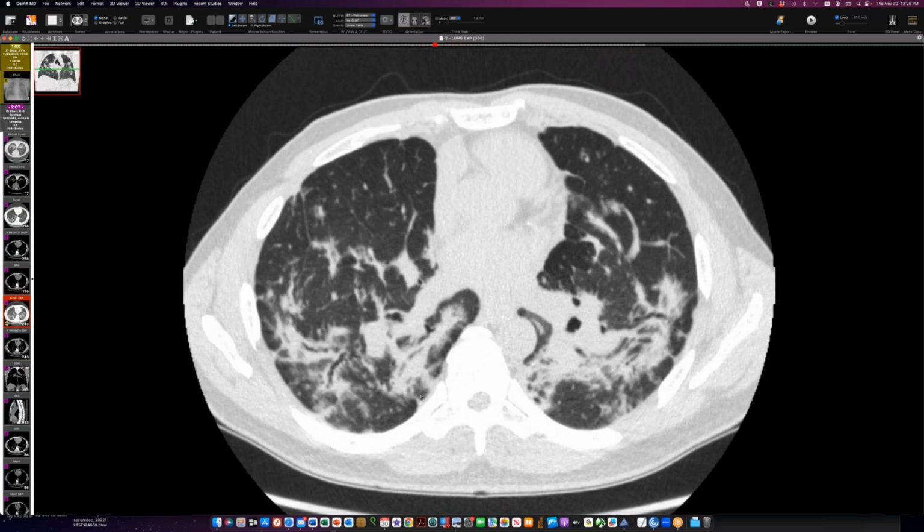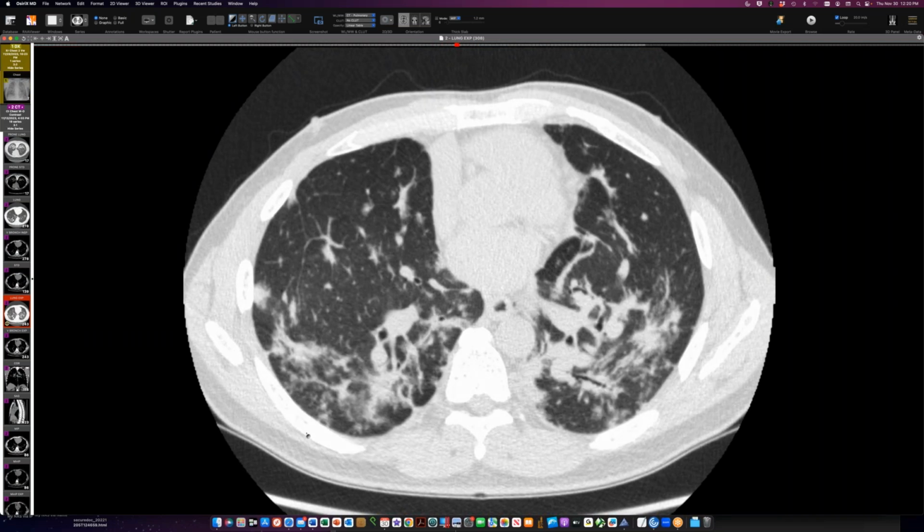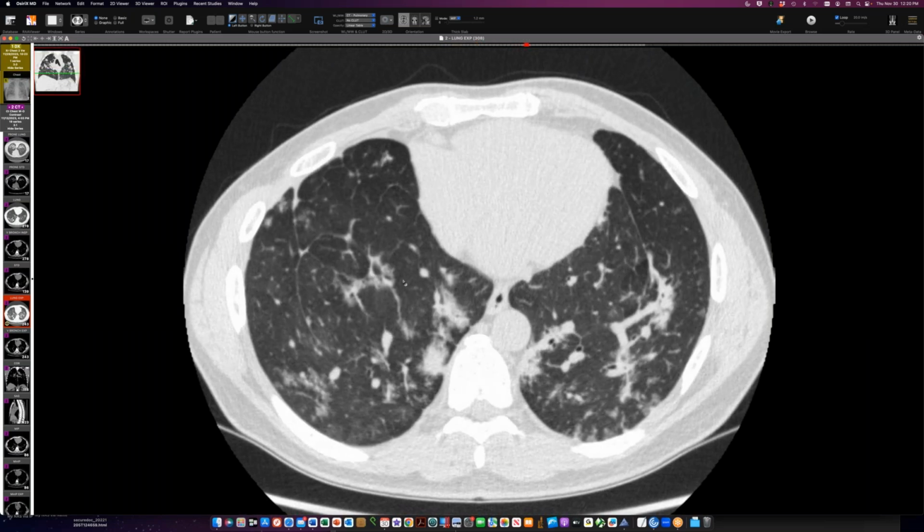Short circuit the whole process. You don't want to perseverate, huh? Perseveration is the fun. Okay. Yeah. If he had the icing sugar lymph nodes, it'd be a slam dunk, but we don't have that.